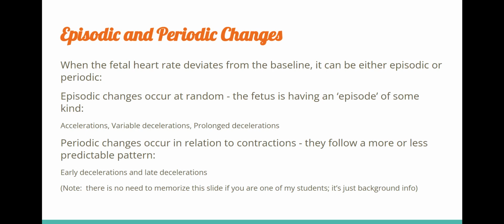If it's 10 minutes of a lower heart rate, what we have is a change in baseline, and now we're going to call it bradycardia instead of a prolonged decel. And we don't like to see a prolonged decel last.